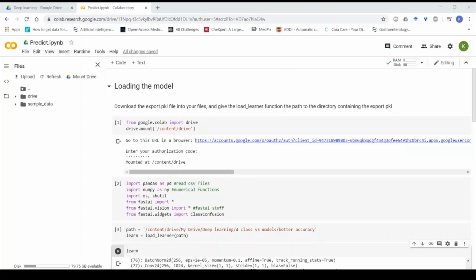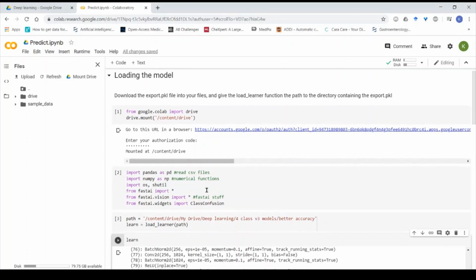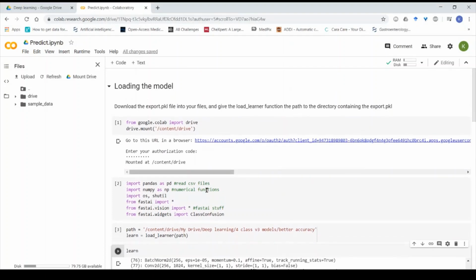Hey, I'd like to show you my model to predict whether a patient has COVID-19 or not, given an X-ray image of the patient's chest. Using this model is super easy. I'm doing it on Google Colab because it gives lots of free GPU computing power, which is necessary for the program to work on large datasets, but you can honestly do this anywhere that runs Python.